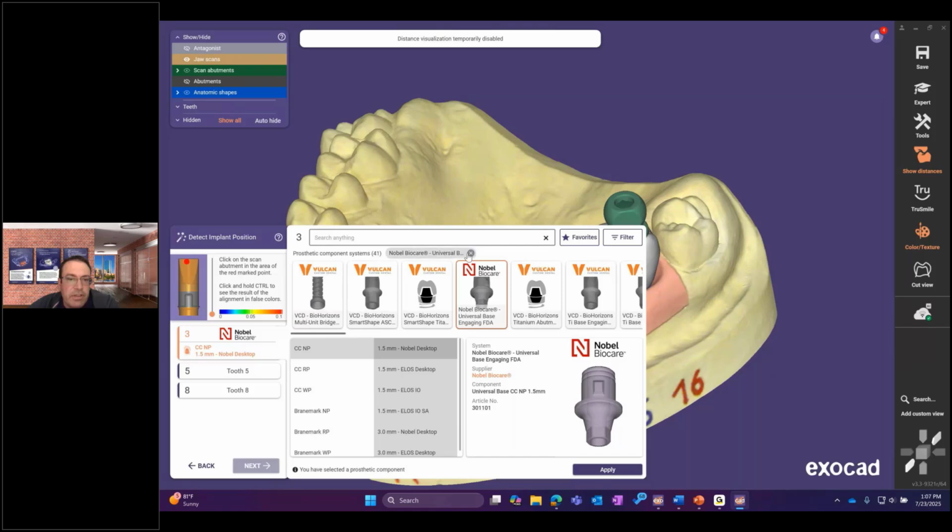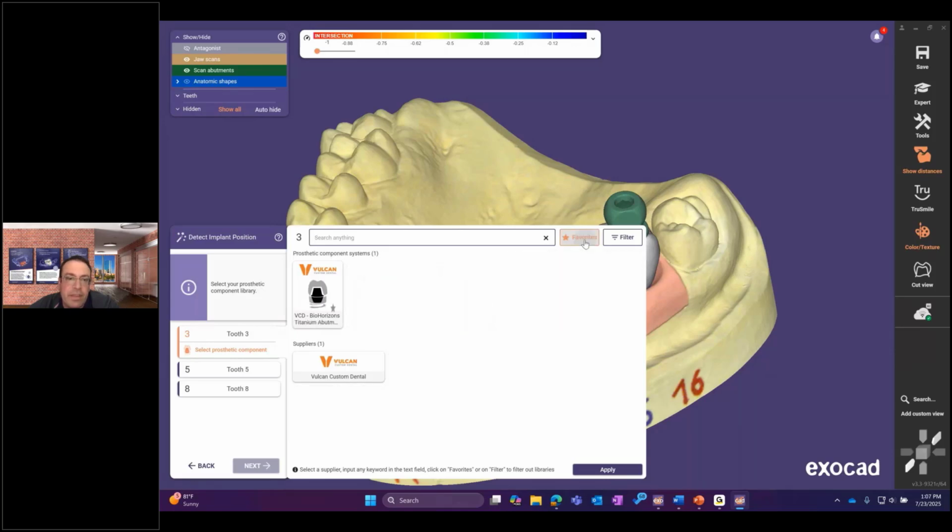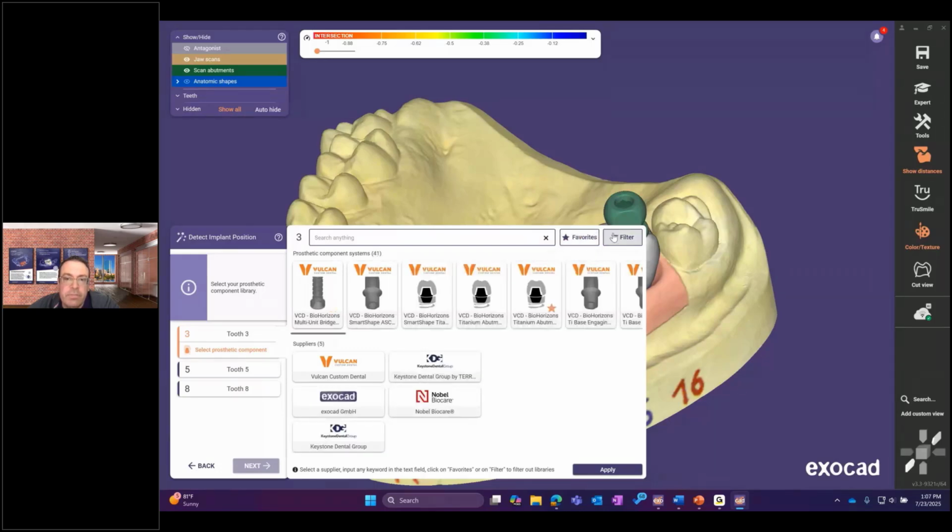All right, so let me close out the filters here. Another thing you can do here, the star buttons. So we still have those to mark favorites here. And then to apply the favorites filter, it's up here to the right of the search bar. You click that, and it's going to show you just the ones that you've starred here. All right, so then click that again to turn off the favorites filter.